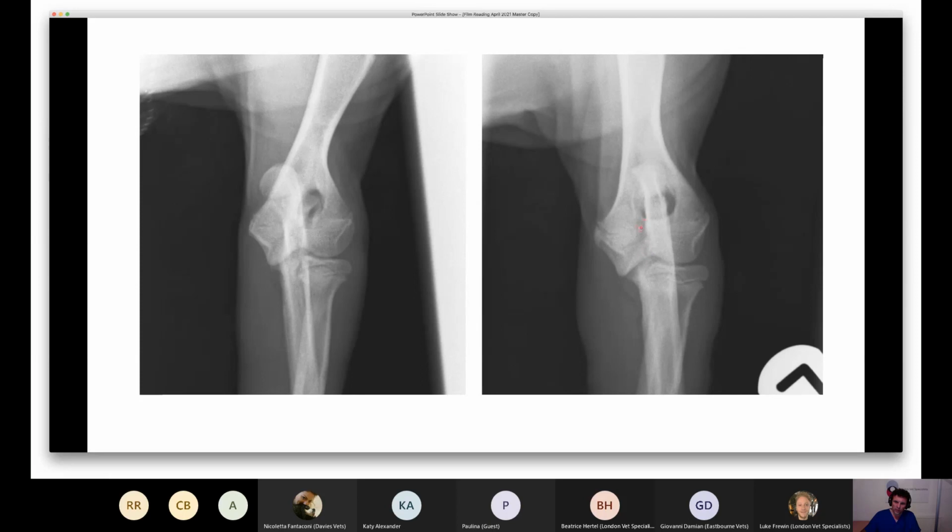What we've got here is a sagittal fissure that's extending from the articular surface of the elbow right the way through to the supratrochlear foramen, and it's bilateral, and associated with this sagittal linear lucency, we've got potentially some discontinuity of the articular surfaces as well. There isn't really much else going on, but these linear lucencies, these sagittal fissures, would probably be the best way to describe them. You wouldn't expect to see that in a dog that was 6 months old.